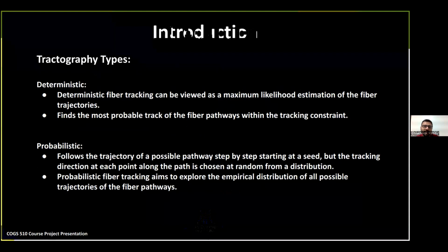Like I was saying, there are basically two types of tractography. The first one is deterministic, which according to the definition can be viewed as a maximum likelihood estimation of the fiber trajectories. Wherever it finds the maximum of the tensor, it goes in that direction and does the reconstruction of the fiber pathways.